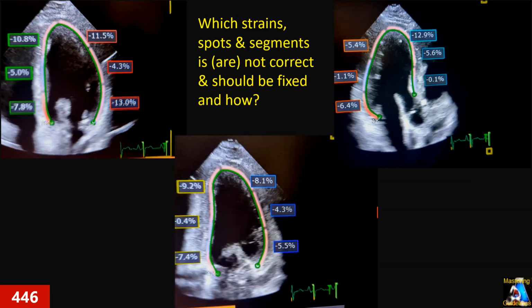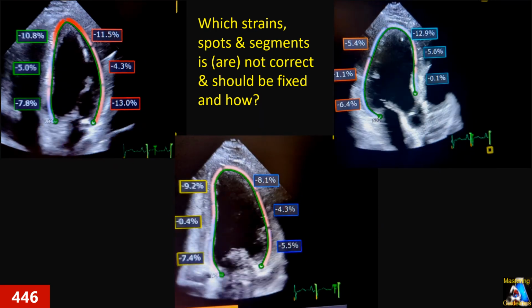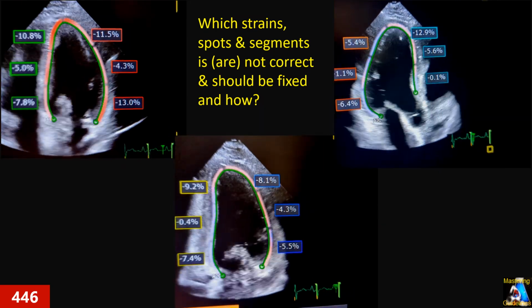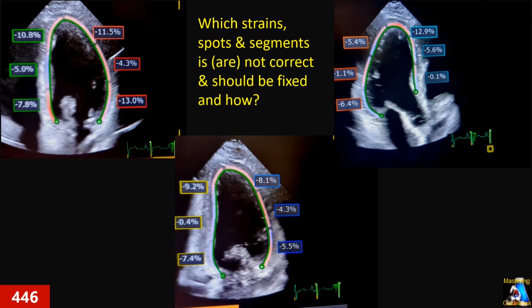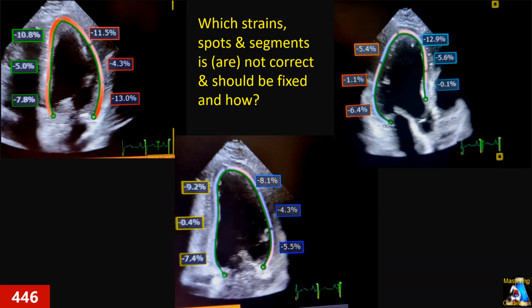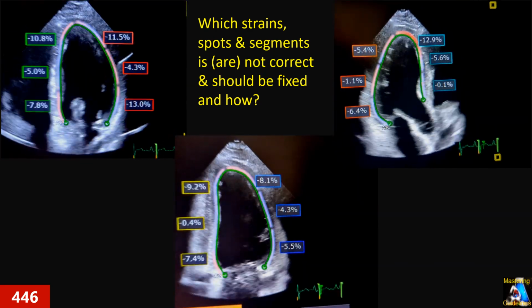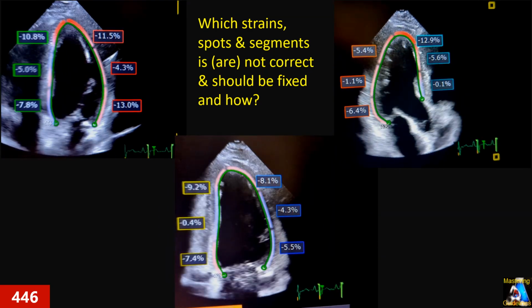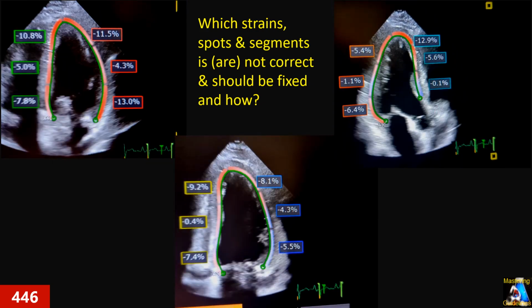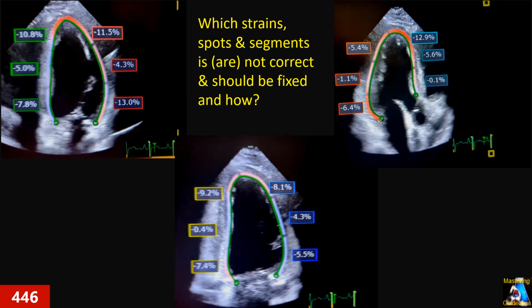So please, before you go and find the answer at the end of the lecture, first pause it and fix for yourself whatever you think is wrong. Pause it and even write it down and make sure you check everything. And at the end, we go together and find out which one is correct and how we fix it.